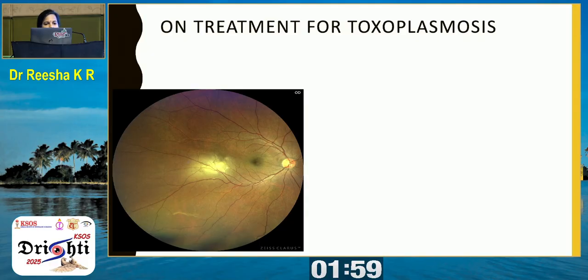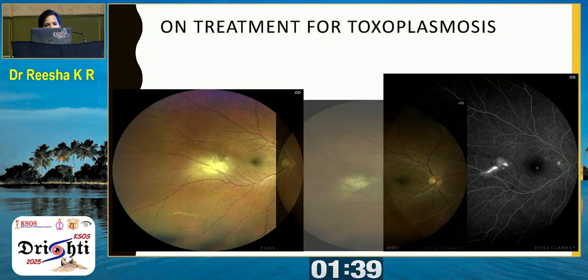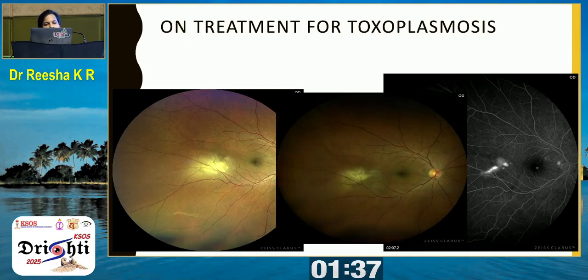So, what could this be, again a yellow lesion. The patient was on Bactrim DS for toxoplasmosis, but no vitritis, no signs of any inflammation. So, we just did an FFA. See what it is. It's a fibrin CSR with CSR leak. On the same day, we did a laser, and the fluid completely resolved.